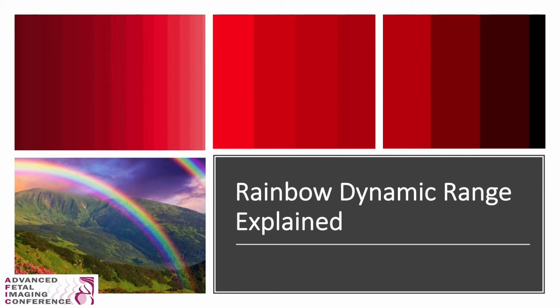Now let's look at the image in the middle. We can see fairly well where the different shades end and they begin. Notice there are also less amounts of shades in this image. I would call this image smooth, but not blendy. And finally, let's look at the third image on the right. Not only are the images very distinguishable from each other, but there is a definite contrast between the shades. There is nothing smooth or blendy about this picture.